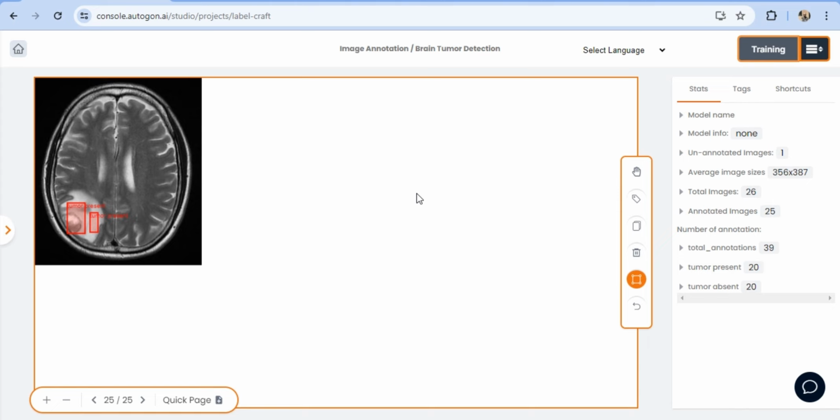But however, I left it at 8 because this is just for demo sake. I'm going to be mentioning all of these things for you to watch out for while you're building your own model. This is very important that you note this. So we're going to keep training, and let's see how long it takes.